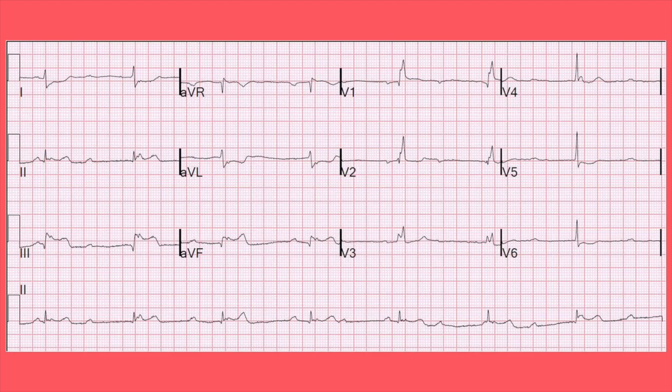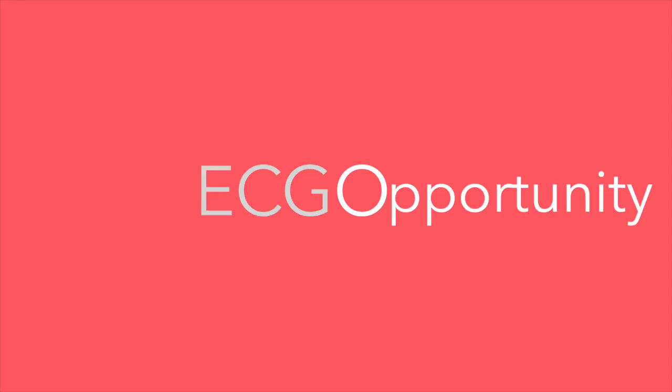its treasures. In a lot of ECG exercises, or even your preceptors, they often just give you an ECG and say, "Go, interpret it all." Yikes, here we go. Hold up. Let's prepare you for that with today's ECG opportunity. Let's get good at each piece one step at a time and really break it down.